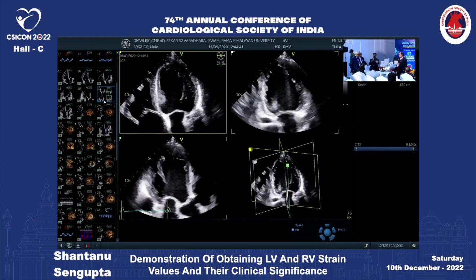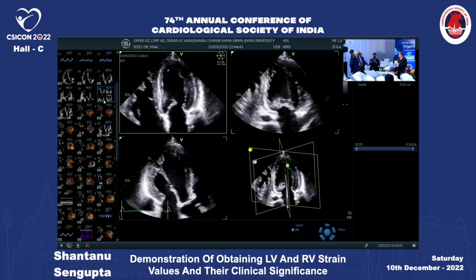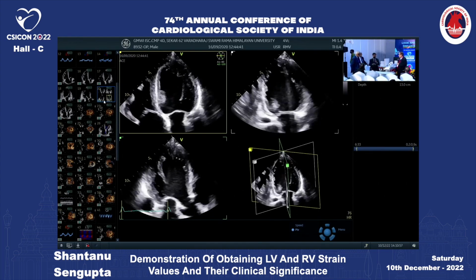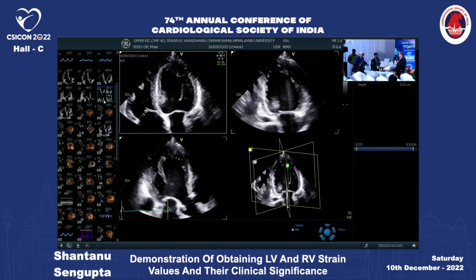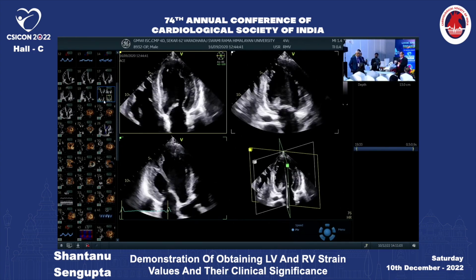In borderline situations, where there's a question of whether to alarm the patient, I think the role of LA strain comes in. I think we can show that if time permits. That's a good point. Finish the LA strain Dr. Shantanu mentioned, and then we will have this.